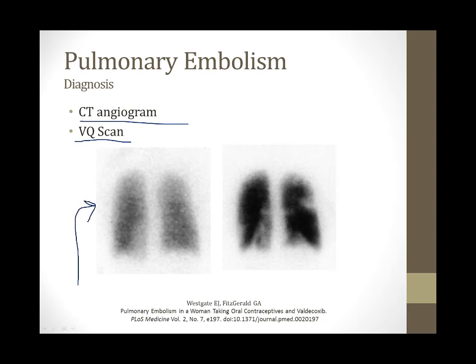That's what's shown in this image on the left side of the screen. A nuclear tracer is then injected into the bloodstream, and this shows you which sections of the lung are being perfused. And you can see in this image that there are parts of this lung that have poor perfusion by the nuclear tracer. This suggests a blood clot is limiting the blood flow to those regions.